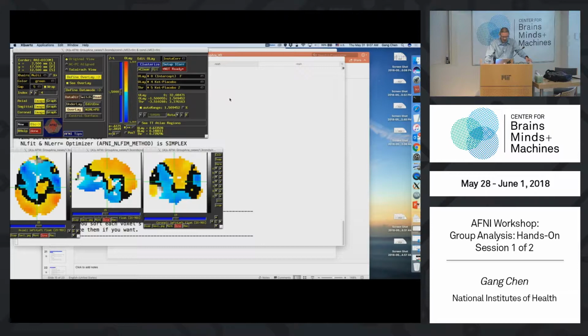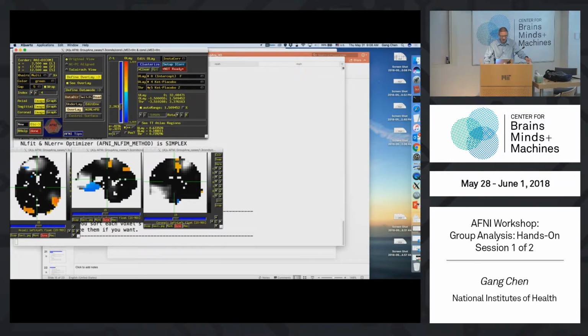I mean z-statistic. So we need to change the range of the threshold bar because by default it's always from 0 to 1. In this case, z is pretty much like t. We want to change the range, so we switch this to 10 to the power of 1 instead of 10 to the power of 0. So now let's move this threshold bar down to something reasonable, like 2 point something. Now you will see some colored blobs, clusters.